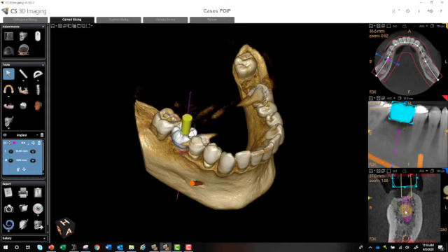The middle node is more of a bodily movement, and the same thing goes in our panoramic curve. I can grab the coronal aspect of the implant and the apical portion of it stays on a fulcrum, and now I'm actually just changing the angle from a mesial distal perspective. You'll also see in the 3D rendering, as I manipulate the implant, you'll see it change on the fly.